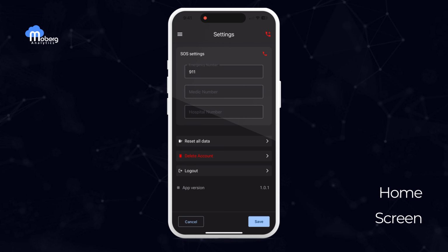Heading into the Settings page, you'll find the SOS settings, where you can configure and save up to 3 emergency contacts. These contacts are accessible throughout the app with just a tap, allowing you to quickly make a call if needed. Below that, there are options to reset all data, which will delete all patient records and assessments within the app, delete account, and log out.